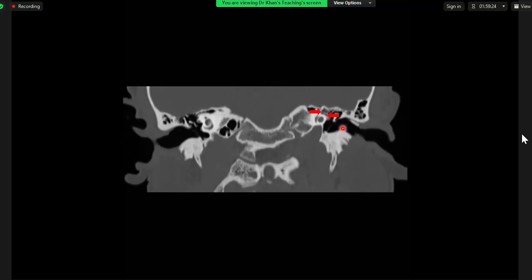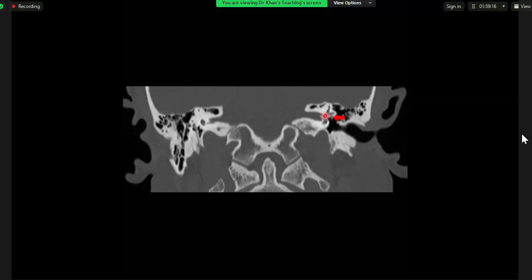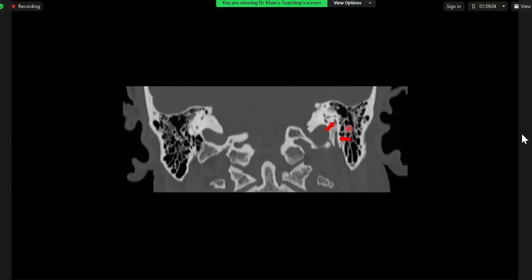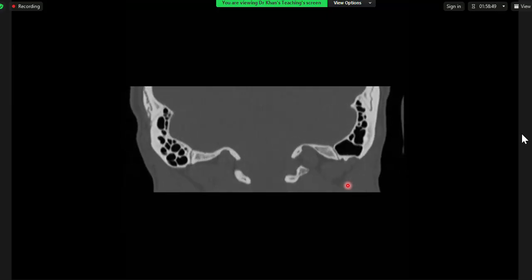So this is the ganglion, and now it is coming down, and it will pass where? It will pass inferior to the lateral semicircular canal. You can see this dot. This is the lateral semicircular canal. This is the superior semicircular canal. And it continues like this. Ultimately, it reaches back and then it dips down vertically. It dips down like this vertically, and then here it will be the parotid gland where it will end in the terminal branches. This is also seen on a sagittal.